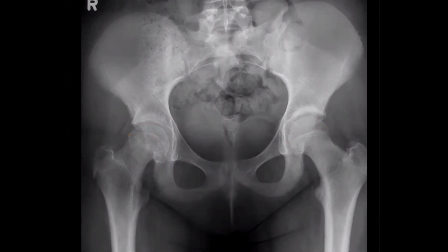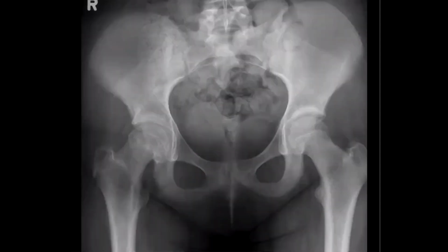Let's see the lateral view. Yes, it is very evident on the lateral view. Okay. Yes, it's frog-like. Line of Klein should be applied on the AP projection, not on the frog position. This is one of the important tips. Also, if you see or localize here, this area is more sclerotic than the rest of the femoral neck. Do you know what the sign is?